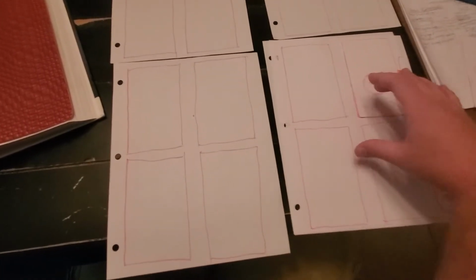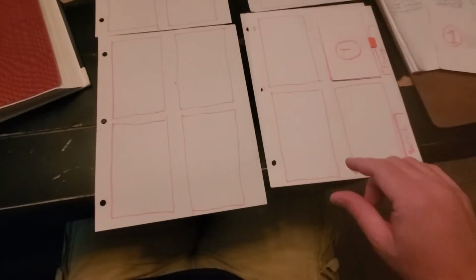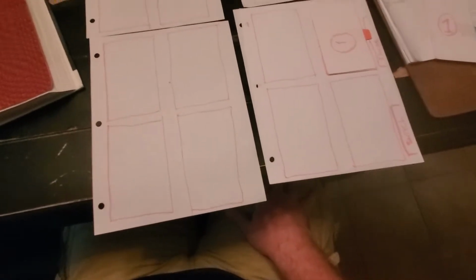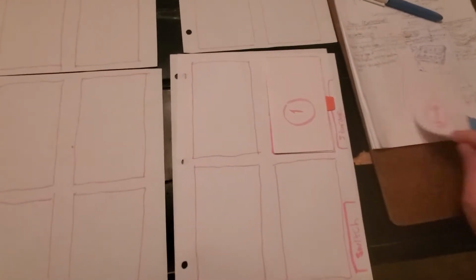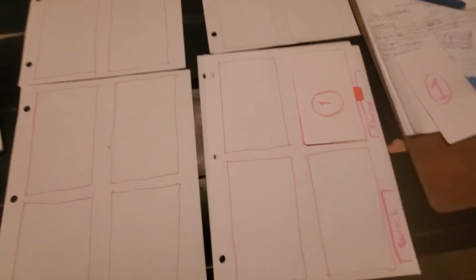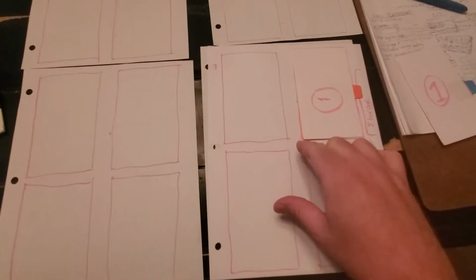So you've got 4 pixels here. That is going to give you your pixel density, or fill factor.